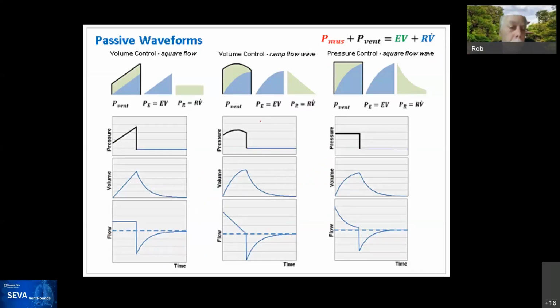Oh, and one other thing, what you're showing here, the waveforms that we see on ventilators or that we show when we're doing graphical analysis, those waveforms are nothing but the equation of motion graphed out. Pressure, volume, and flow, again, are continuous variables of time, and if you plot them over time, you get these waveforms.